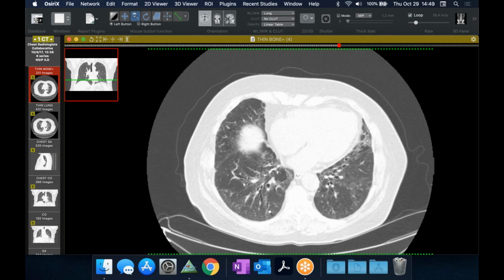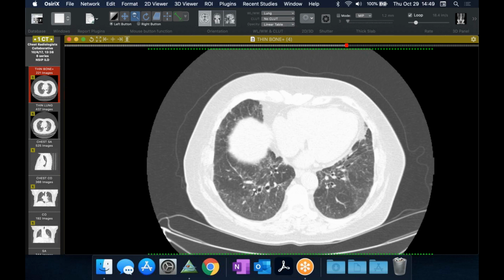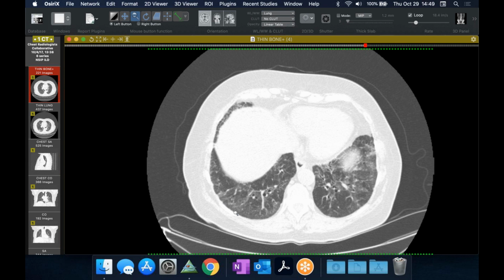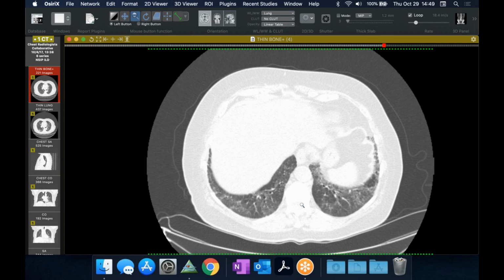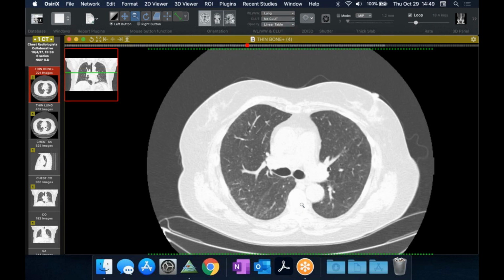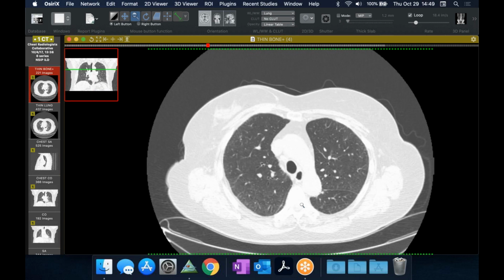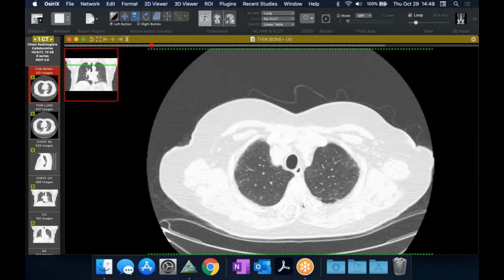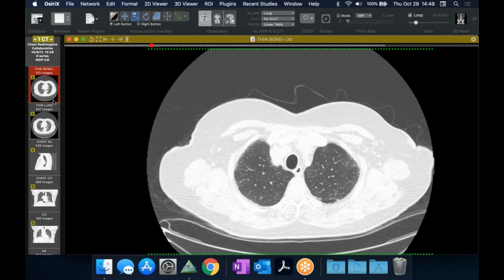Have any of you, I mean, we've seen a couple of atypical cases. I've seen a unilateral case, but has anyone seen this really striking basal predominance of ABPA? I've got two cases, not with the basal predominance, but with, like this one, involvement of smaller bronchi and without bronchiectasis. So not the distribution, but otherwise like this. Yeah, and the clinical findings fit perfectly, and I think the dense mucus, from an imaging standpoint, really seals the diagnosis.